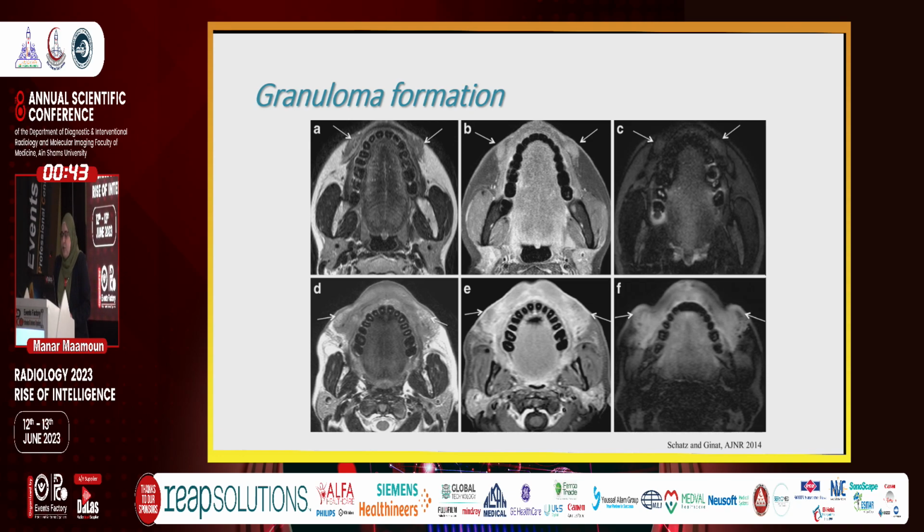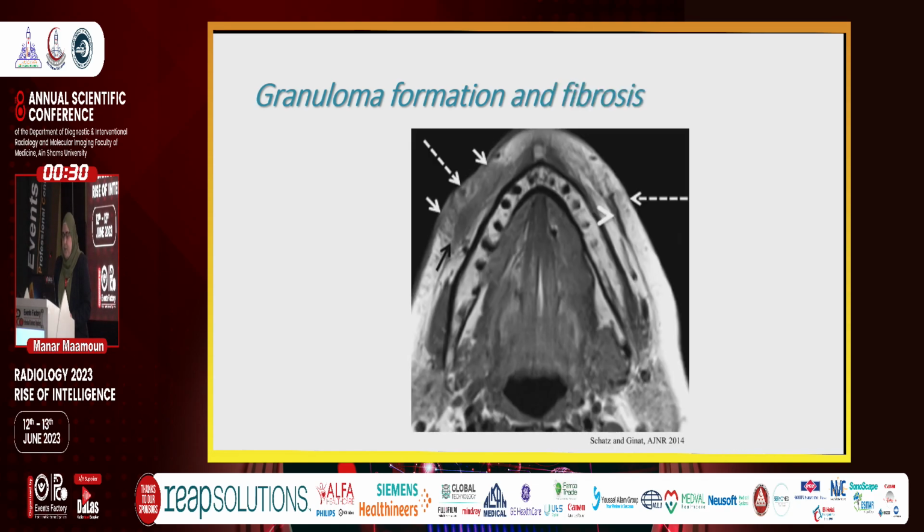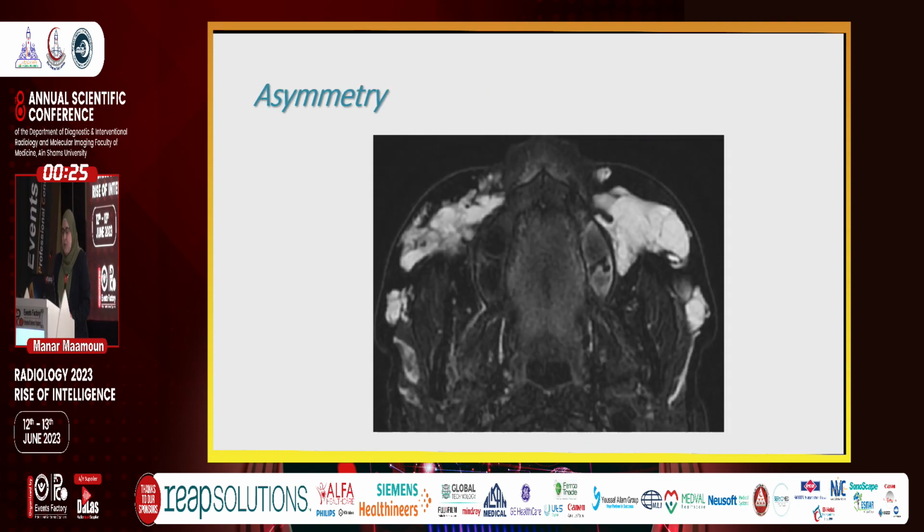This is an example of silicone-only images. The lower image is a silicone material, so it's hyperintense. The above image is a collagen material, so it's hypointense in the silicone-only image. Another case of granuloma formation showing associated fibrosis.